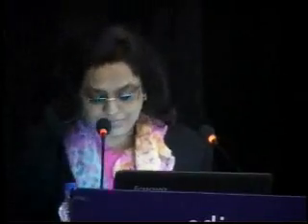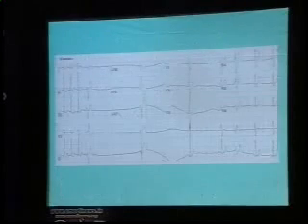Now, once you are doing this carotid sinus massage, you are increasing the vagal tone and the supraventricular tachycardia breaks either to the sinus rhythm directly or there is a block in the node and there is an escape rhythm. And subsequently, the patient will have the sinus rhythm. This is another ECG which I have put up because in case the carotid sinus massage does not work in these patients, you try a very commonly used drug, which is IV adenosine.